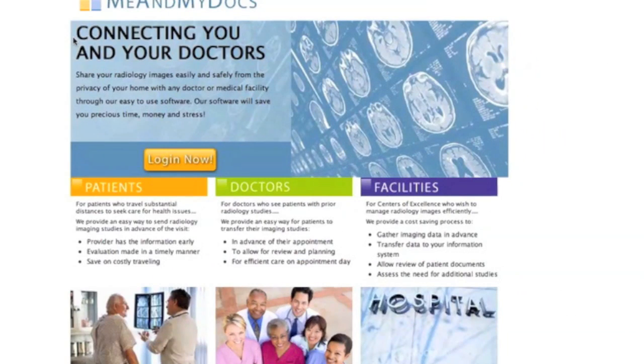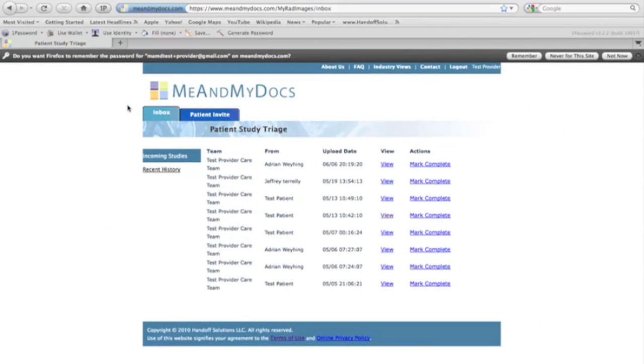Now you'll log on to meandmydocs.com as a provider to look at the studies that they've uploaded. You'll actually get an email notifying you, as will your other staff, that there's a study to be uploaded. This is the view that you have as you log in as a provider, and that is a doctor or a physician assistant, nurse practitioner. We'll just notice that as you log in, you'll see the inbox here. And if you wanted to invite a patient to upload, you would hit a separate tab. Let's look at the inbox first.